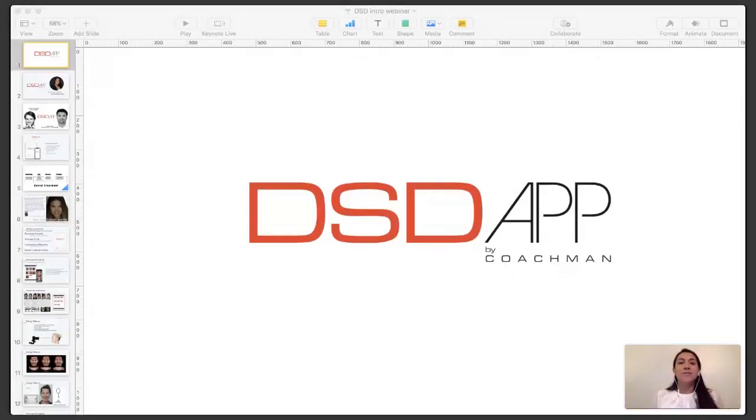So this webinar is mostly an introduction for you to start using the DSDApp. I want you to take advantage of this brief overview, and I'm going to teach you how to create a nice and harmonious looking smile simulation. Okay, so let's get started.